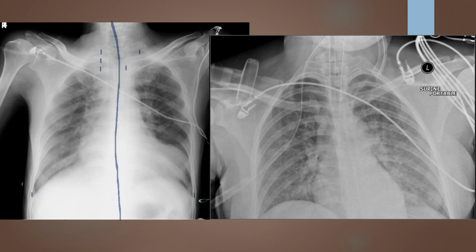Our patient is pretty much in alignment with the long axis of the IR, so that looks good. If I could window and level and make that image demonstrate a little bit better penetration, or especially if my exposure index was within range, I'd probably go ahead and approve this image. If my exposure index was out of range or I couldn't get a better look through some of that denser tissue, then we would go ahead and repeat.